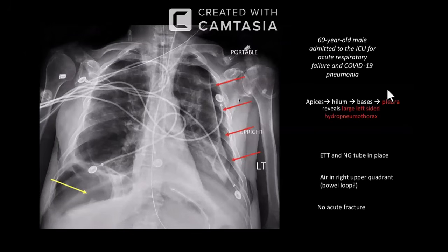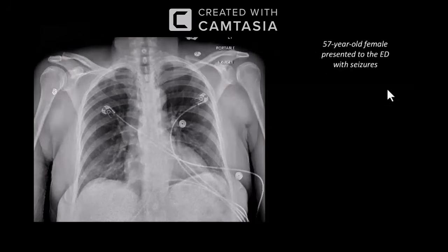So yes, that's the pneumothorax. You need to urgently inform the surgeon. We need to put a chest tube for this pneumothorax. Actually, you can see some air fluid level. I'm also not convinced, but yes, there is definitely a pneumothorax with possible blunting, but pneumothorax is a fair answer in this case. Okay, next case.